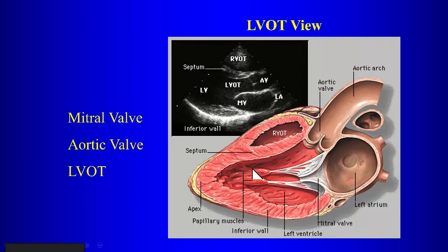Now I'm showing you echoes, which is what they also use in echocardiography. They'll use the same views that we use, or very close to the same views that we use in MR. So it's not unusual for us to look at echocardiograms. And many of these patients have abnormal echoes, and that's why they're sent for MR. So if you know MR imaging, you can actually look at these echoes and get some anatomic information.